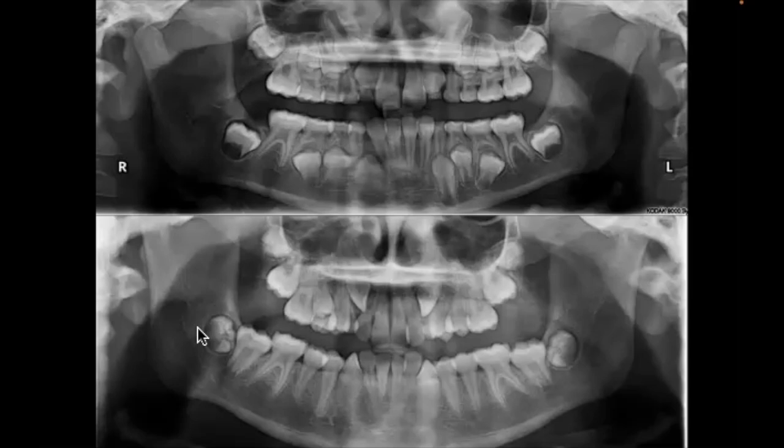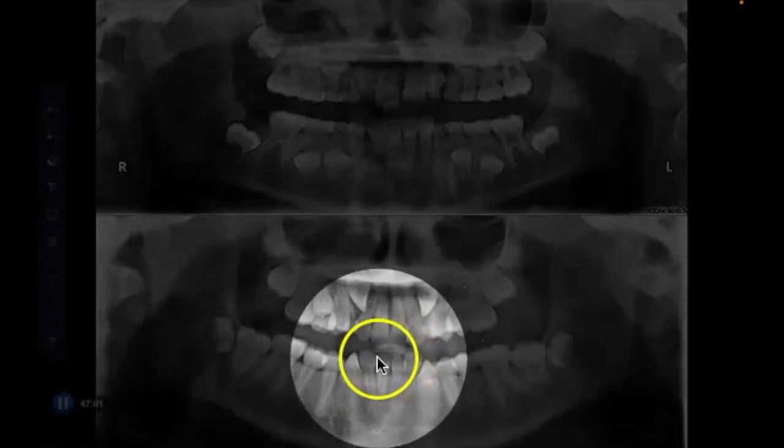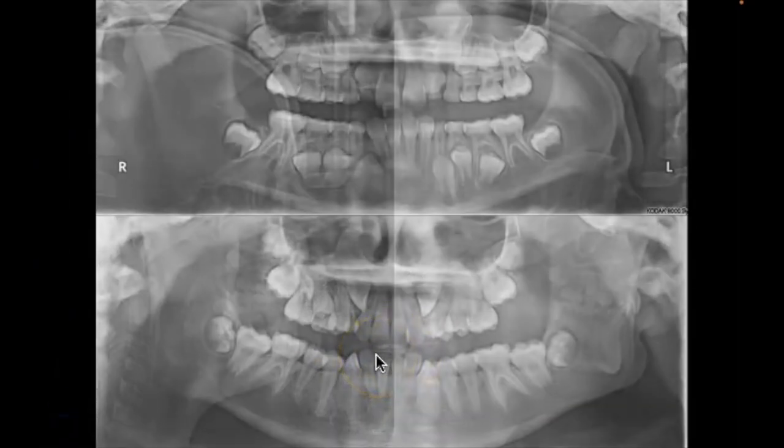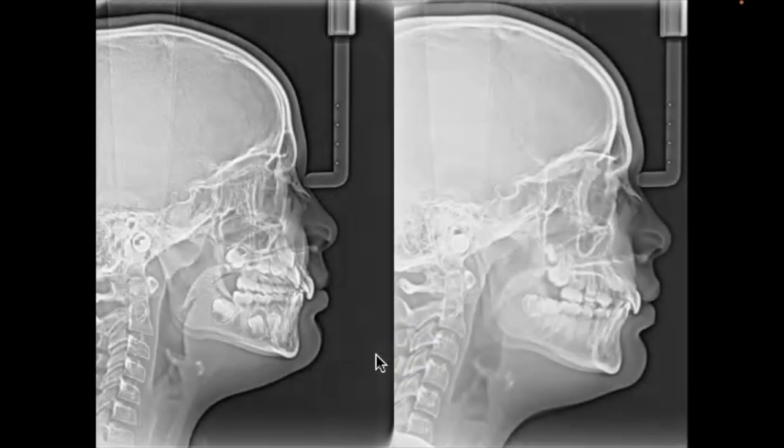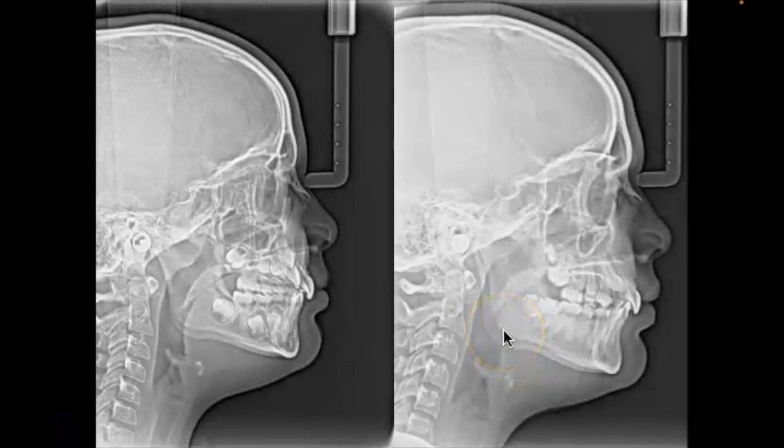What about the edges of the mandibular anterior teeth? Okay. How about our deep bite? Did we do a good job correcting our deep bite or opening up the bite? We still have our potential asymmetry here, or bad head position, one of the two.